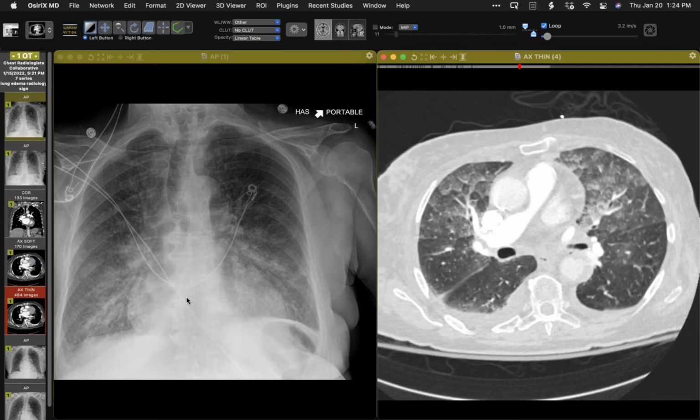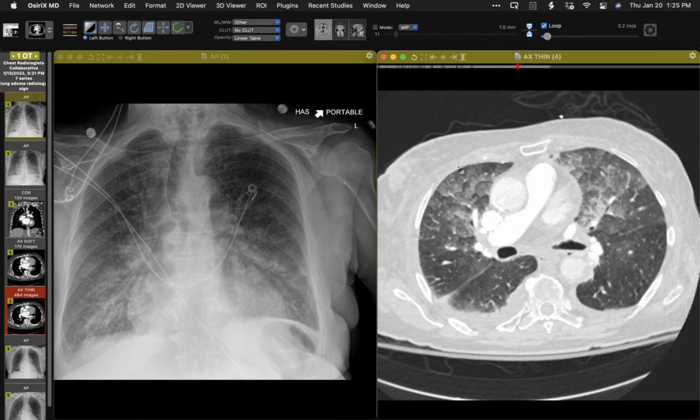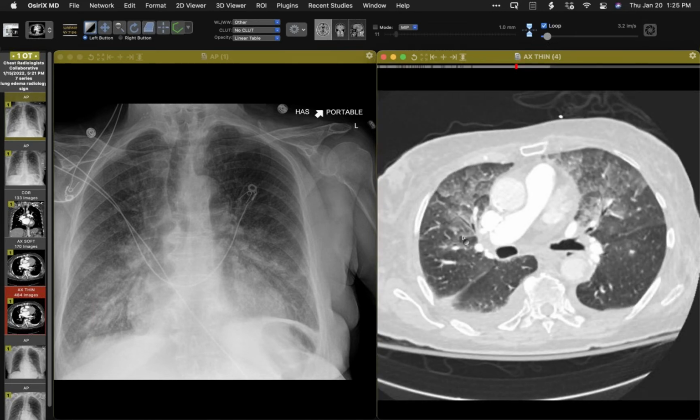Yeah, that's a nice example of that appearance. Yeah, so the so-called intralobular gradient of water. And yeah, there's a Chinese picture of karst mountains that the authors of that article included. It's kind of artistic license, but they sort of analogize that to the appearance of the karst mountains in that painting.